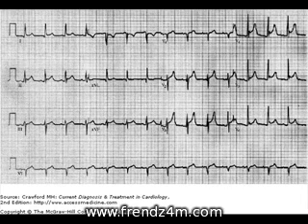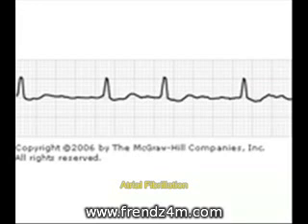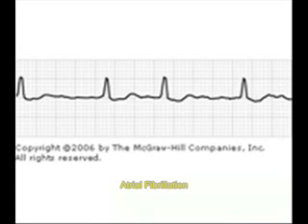Now you can see this one. This is fibrillation, atrial fibrillation. Atria, there is irregular rhythm. Atria are contracting very irregularly. This is atrial fibrillation. In atrial fibrillation, the atria just contract irregularly, and that needs to be treated with medications like diltiazem.